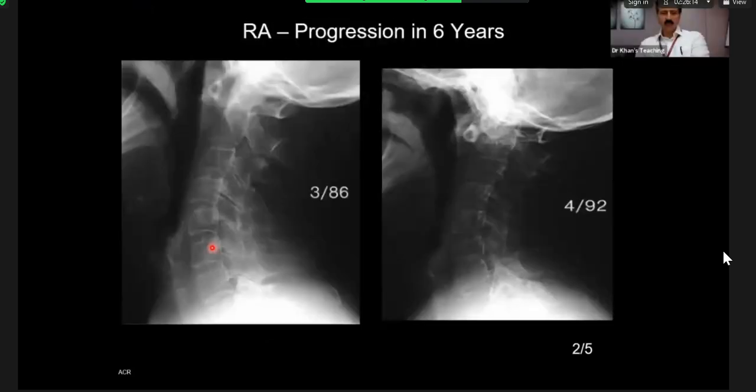Good. So if you see here, this is an extremely important exam case, and I will show you a few other concepts around it. Now, what happens is that this is the dens, and this is the arch. And here, what has happened? The dens has gone into the foramen magnum. Candidate 3, can I ask you, what do you think has happened? Why has it gone in? And the patient is a known case of RA, you are right.